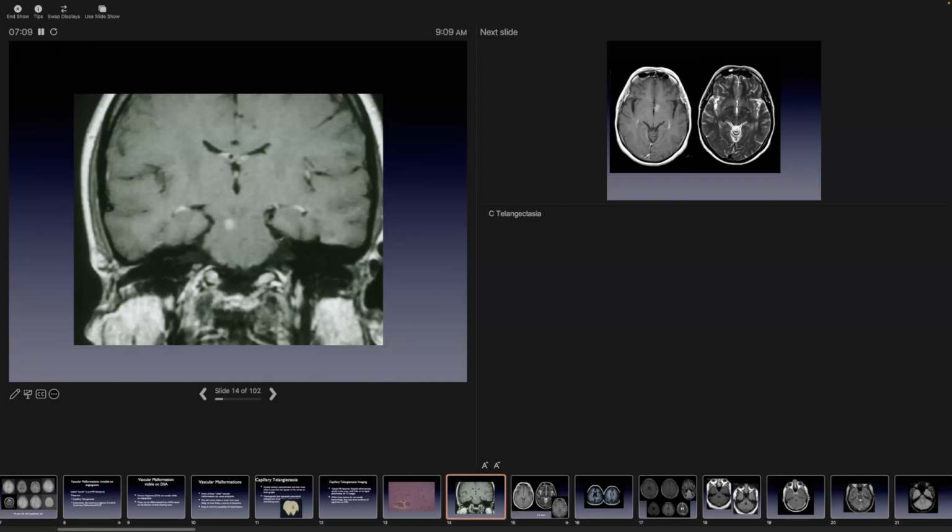Now, in a patient with cancer, for example, small cell lung cancer, when you see a lesion like this, I think the prudent thing to do is just to bring them back for a follow-up scan. What I think would be a mistake is to just call it a metastatic lesion and then go on to, say, radiation therapy. So again, be aware when you see these areas of enhancement.